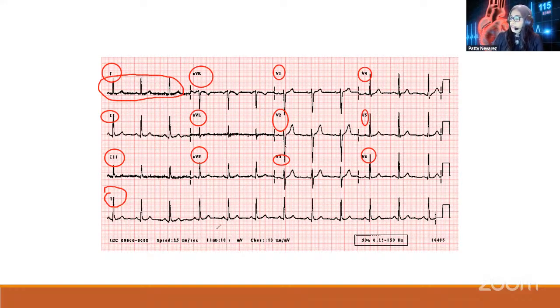Another thing to look into on an EKG strip, there are a couple of things. We need to look at the speed, which has to be 25 millimeters per second. It also has to have a voltage of 1, so this is 2 large squares. So 1 square, 2 squares. Your voltage has to show like this. That means your machine is well calibrated and at a regular speed.